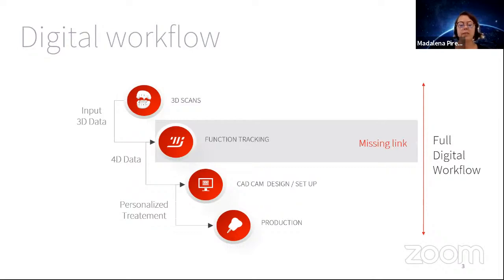Of course, if the dentist doesn't have an intraoral scanner, we can also use the data that has been scanned in a lab. So the models that have been scanned in a lab. This is totally possible. So we offer the function tracking, which is the 4D data.